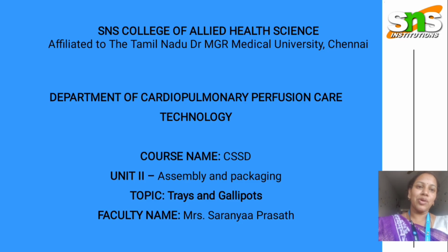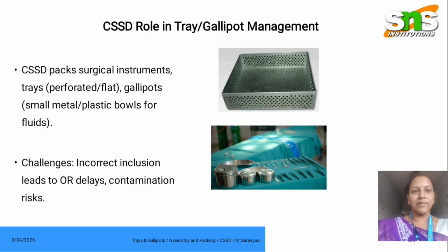Today we are going to see a topic on trays and gallipots, which comes under Central Sterile Supply Department, assembling and packing. The major role of the CSSD team is to assemble the surgical instruments in a tray and to do a proper sterilization technique. For this, the instruments have to be placed in a proper tray which has to be perforated and flat. It should not cause any damage to the surgical instruments.